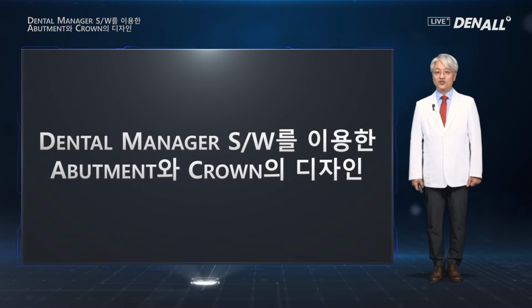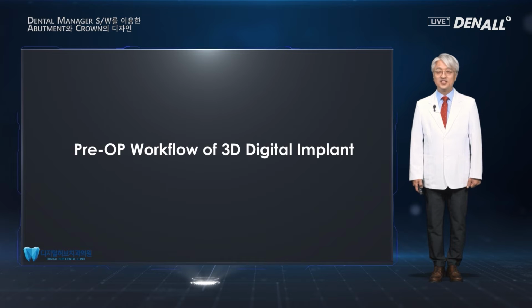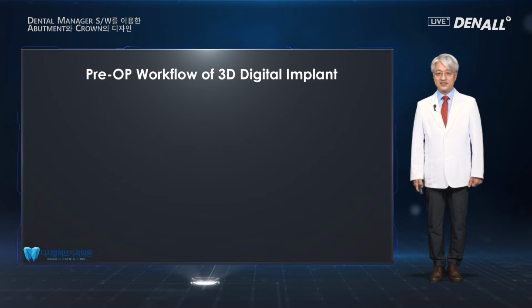We are going to talk about the design of abutment and crown using Dental Manager software. Before, I talked about the 3D implants, and briefly, let me talk about the pre-OP workflow.